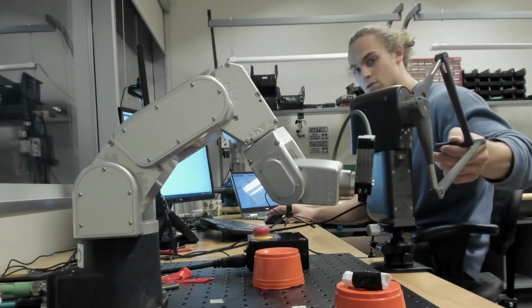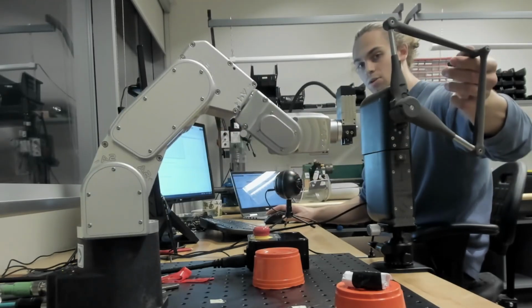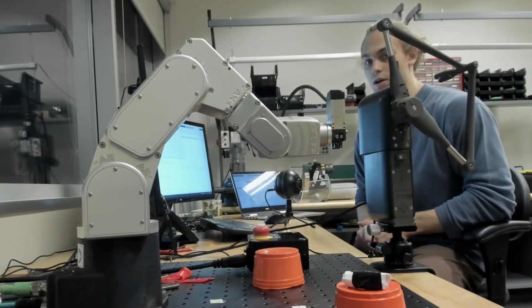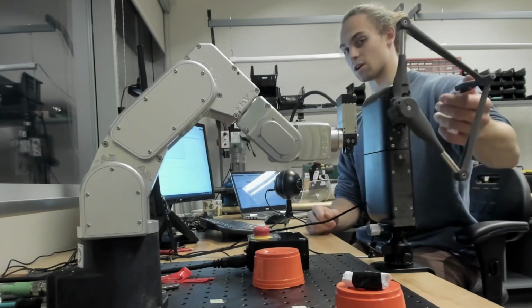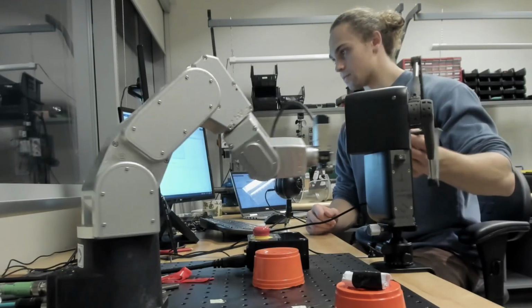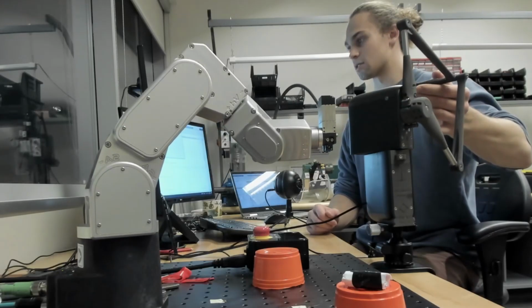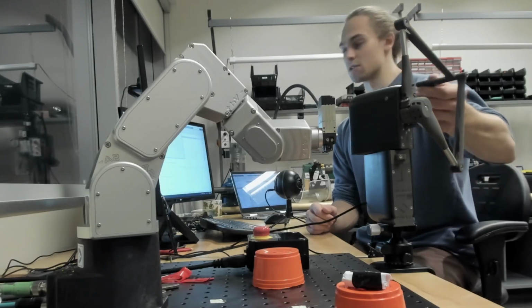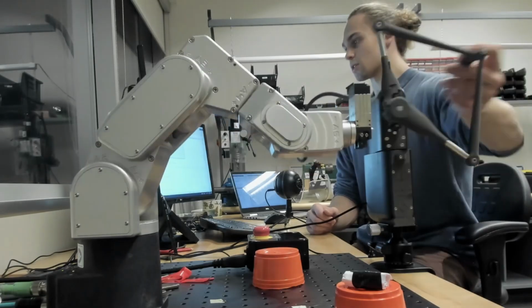So it's moved its joints, and now we're going to do teleoperation with it. So I've set this to have a pretty mild Z mapping. Once you guys are comfortable with it, you can change it, but this is just so that you guys don't pick up the haptic device, start the program, and slam the robot into the table. But since you're using move lin, it's pretty good, and you are keeping the Euler angles constant even in between the samples. So this is what it looks like.